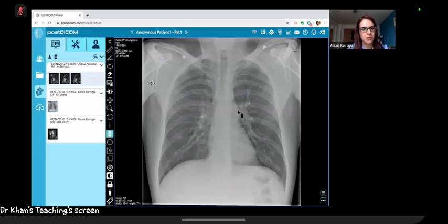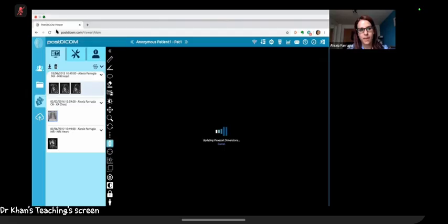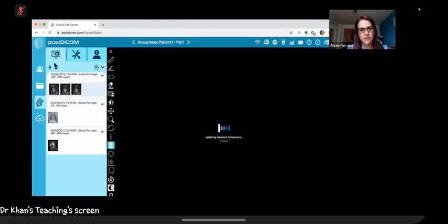Unfortunately, I don't have a pre-op chest X-ray to look for rib notching and the manifestations of coarctation pre-op, but that was great. Well done. I'm aware that you don't see too many CMRs. So that was really good.